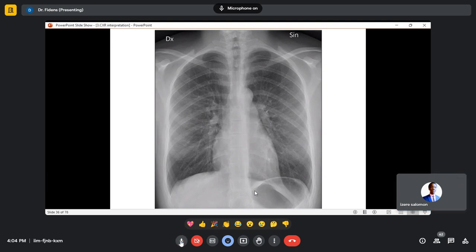Fundus. What do you mean by fundus? This is the fundus. The fundal wall is in contact with the diaphragm here because it's filled with air. It's in contact. And that is the question. It is a gastric, how do you call it? Gastric folds, gastric fold.